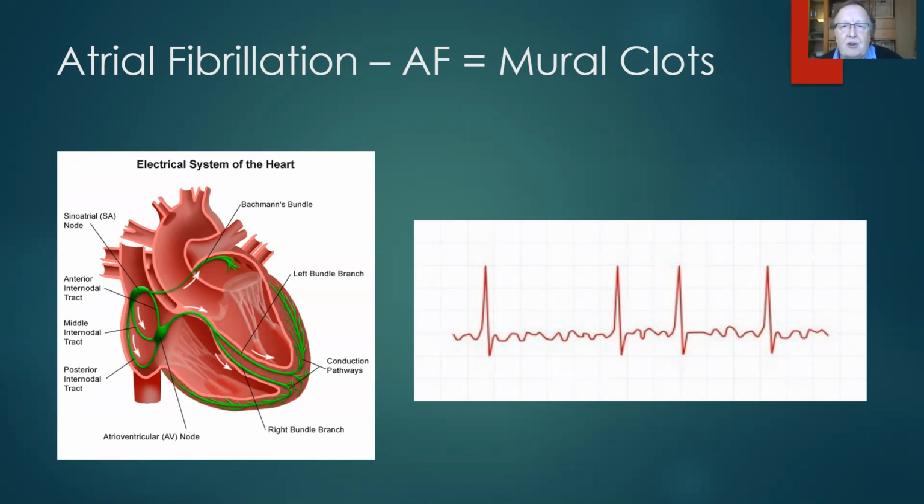Are the P waves all the same? Oh, no, they're not. Are the P waves before QRS complexes? Most of the time. QRS after P wave? Most of the time. But we can see that the QRS complex is normal, as in 1 to 3 small squares, and the T waves are present.